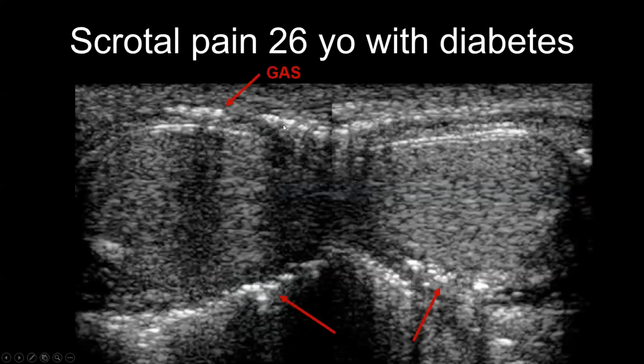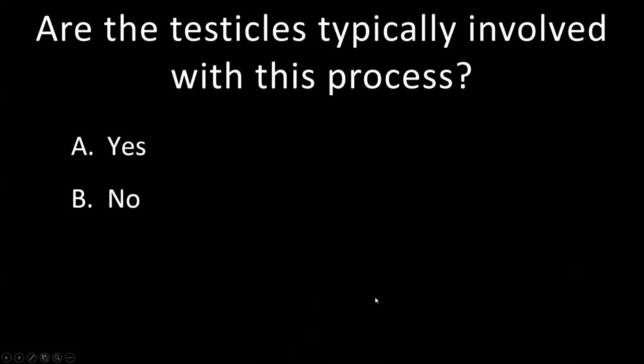Gas in the scrotal wall. And we can see these echogenic foci with their dirty shadowing. So this is necrotizing fasciitis in this diabetic patient who is quite young. My question to you: are the testicles typically involved with this process? Yes or no? The answer is no.